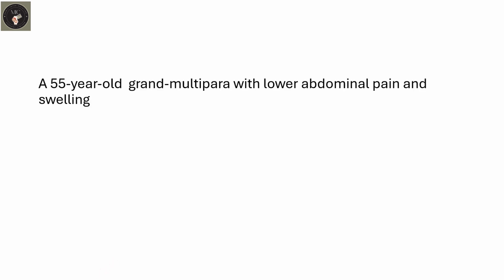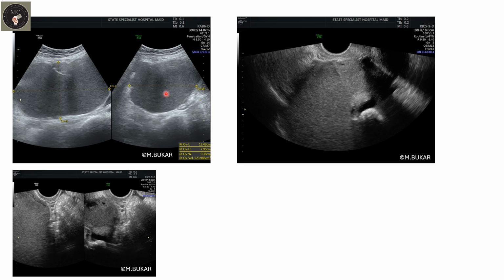Is this case a case of dermoid or endometrioma? The following images were seen in a 55-year-old multipara who presented with lower abdominal pain and swelling. So look at the still images on trans-abdominal and trans-vaginal images.